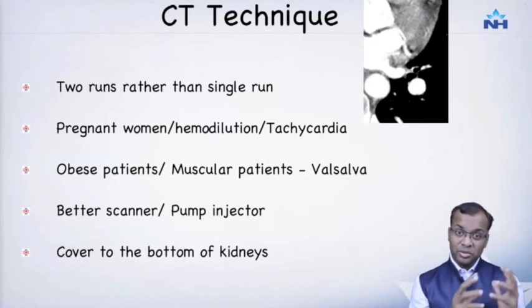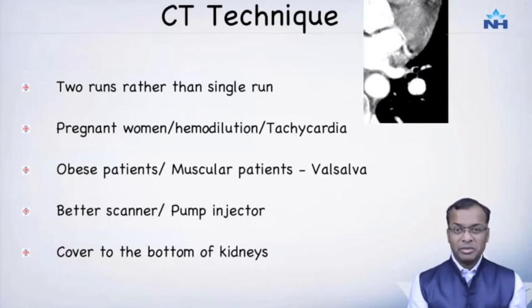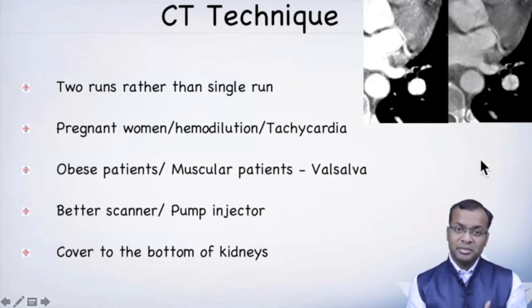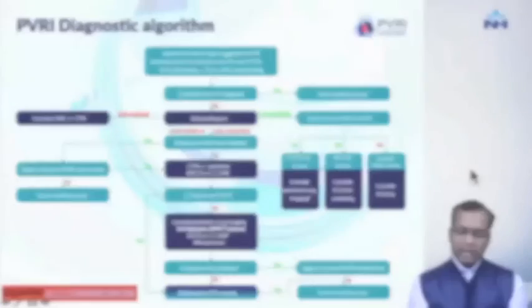We look at the lungs, making sure there are no primary pulmonary parenchymal abnormalities to account for these patients having PH. Also, we don't like to look at printed films when we are looking at pulmonary angios. You can see this is a patient and this is what a printed film would look like. You would think this pulmonary artery is normal. If we adjust the contrast, you can see that this patient actually has a web, and this is a patient with chronic thromboembolic pulmonary hypertension.